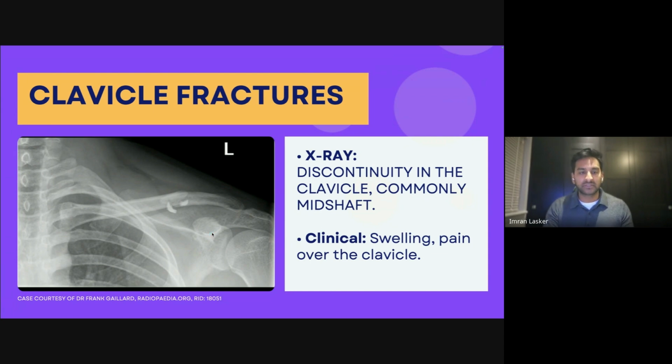And again, I talk a lot about bodybuilding. When people are doing a lot of bodybuilding or repetitive movements, you can actually get osteolysis of the distal clavicle, so that can get really, really shortened over time as well. But generally speaking, when you're looking at trauma, it's going to be the middle third. If you split it into one, two, three, it's going to be this area here that's going to have the fracture. Like I said, mid shaft or middle third, it doesn't matter. It's going to be one of those two.